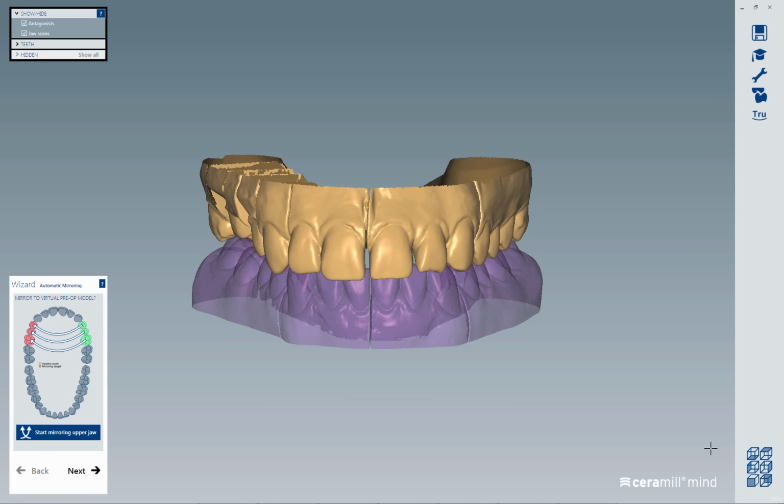Some have a fixed position and are still in the same position in the working window. We will begin with the wizard. The wizard is now firmly fixed on the bottom left on the screen. Directly above, also in a fixed position, is the Fade In and Out window group.